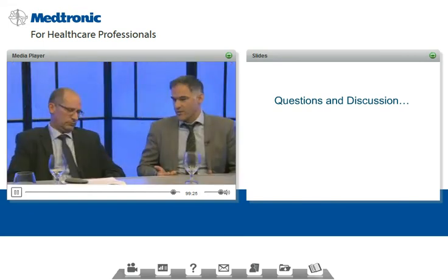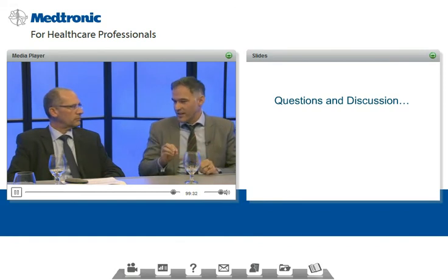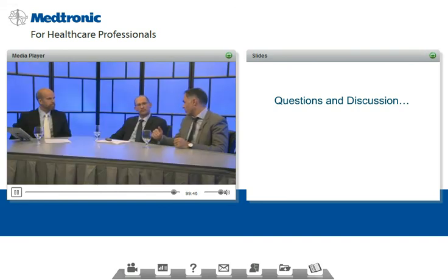Yeah, actually, if I can answer that first. For me, it's on that version of the quick view summary. I like to get a look at that to see if basal is in the range of 40 to 50%, just as an initial screen. If it's dramatically out of that range, it could very well be that it's there for a good reason, like the person on a low-carb diet. We expect them not to have lots of boluses by day. But it gives me a quick screen.